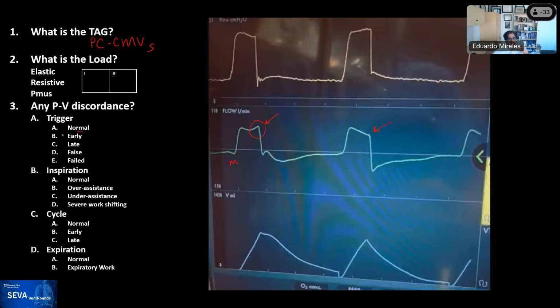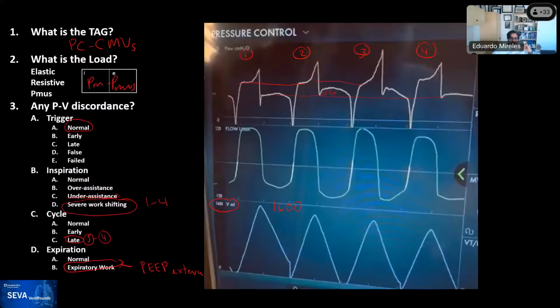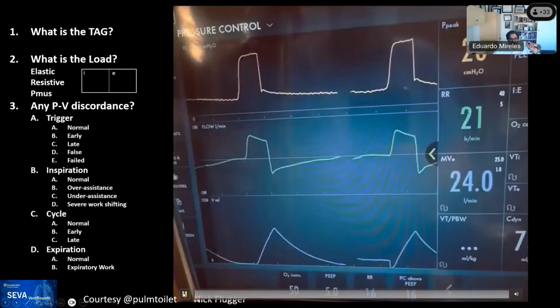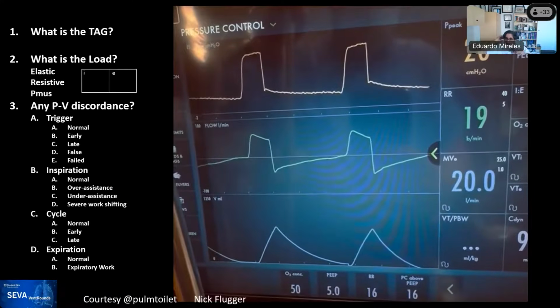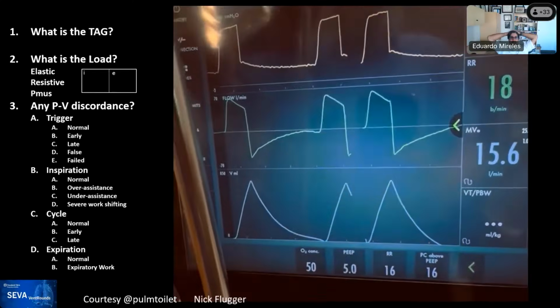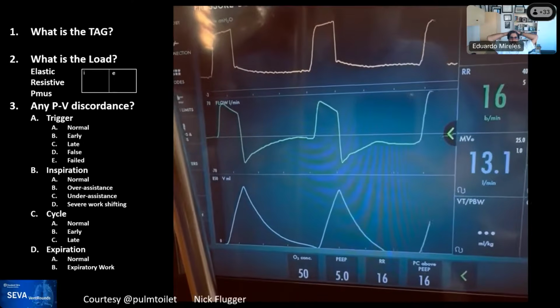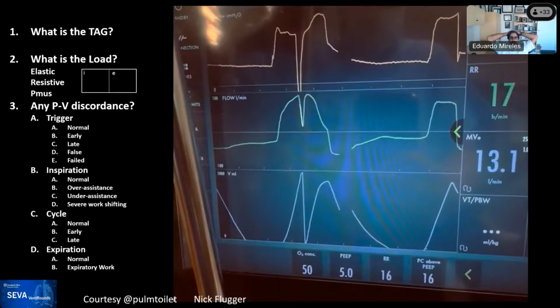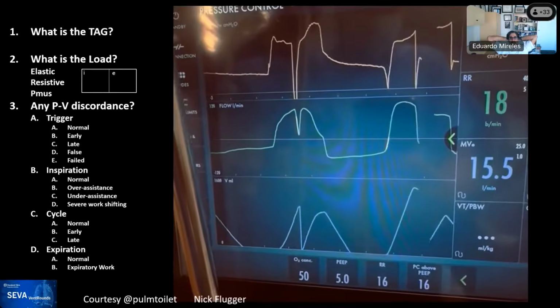This is another example of early trigger. So one, that's an early trigger. The second is a completely passive breath. Again, it goes into that passive state with a little bit of activation of the expiratory muscles. So this is the sequence that you see here, and I'm going to play it again and we'll talk about it. I know that many of you came in later, but look at the sequence now: it's passive, there's expiratory muscle, then early trigger, expiratory muscle, early trigger with early cycle, double trigger, expiratory activity.